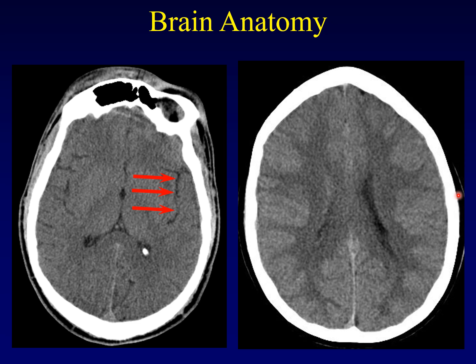It's got a few things dissolved in it, but it's essentially water from a physics perspective. So there's water in this object, and that is the largest of the sulci, the Sylvian fissure. The Sylvian fissure separates the temporal lobe from the insula.